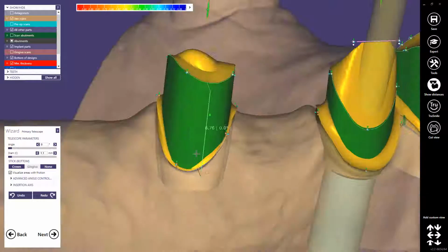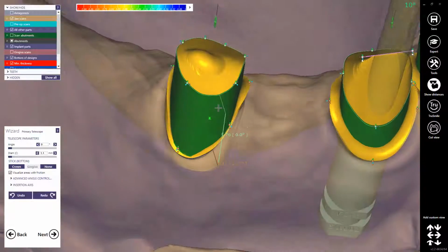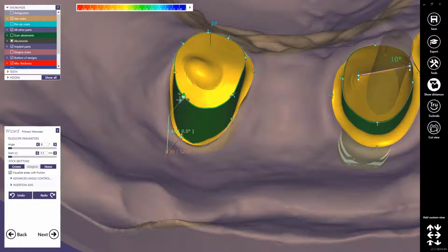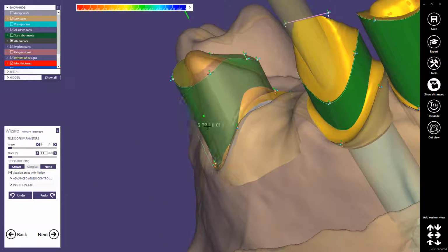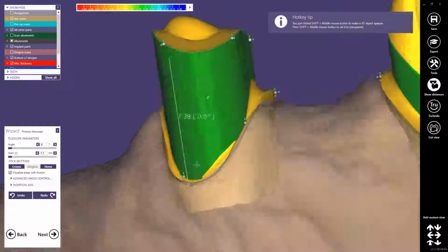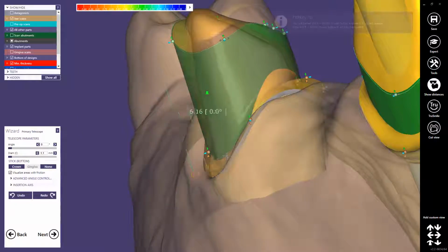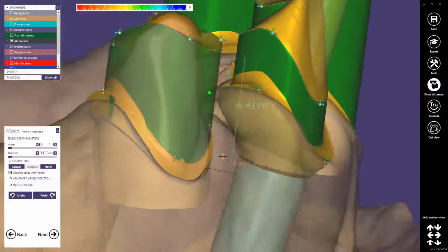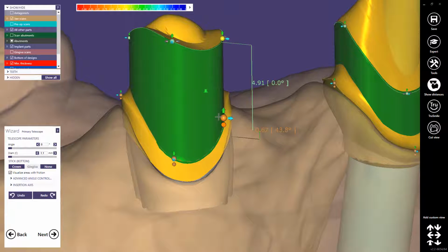Maybe you recognize now, once I pulled down the points here on the border, the telescope got thicker, and that's the problem. As we are always trying to do primary parts as thin as possible, you can see here that it's much thicker than the minimum thickness. This is because of the placement of my border. If I would go higher, then I can go inwards and it gets much thinner, and this is how I also can do it, like this.